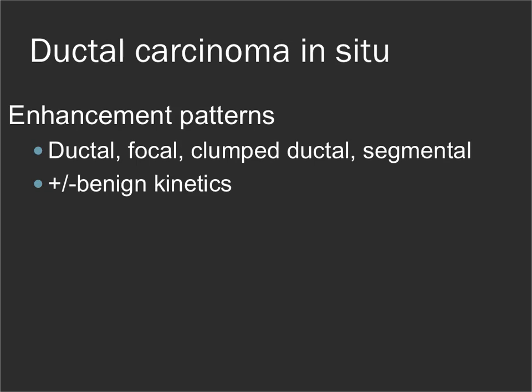DCIS can have a variety of different enhancement patterns, and MR is actually really pretty good at looking at DCIS, and the higher grade the DCIS is, the more likely we are to see it. But we do know that we can miss particularly low-grade DCIS on MR.